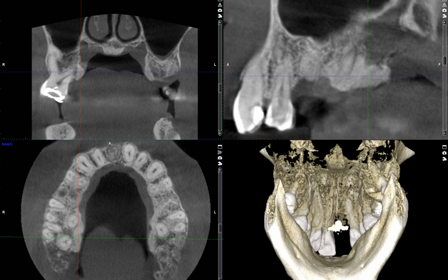In today's video, I would like to go over palatal exostosis in CBCT. First of all, based on my experience, exostosis tend to occur more along the buccal cortical outline of the maxilla or mandible. So that's more common. However, every once in a while, I do see exostosis along the palatal cortical plates of the maxilla.